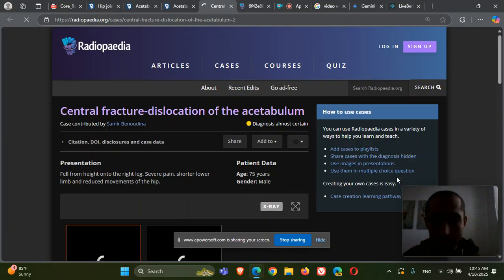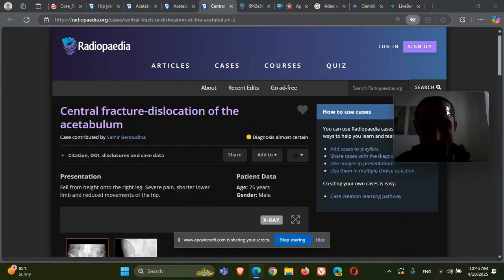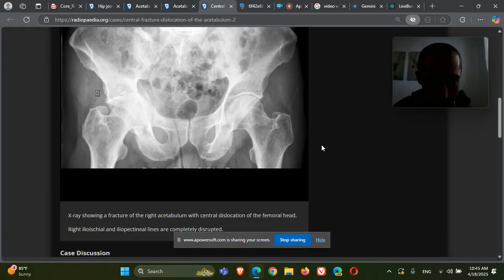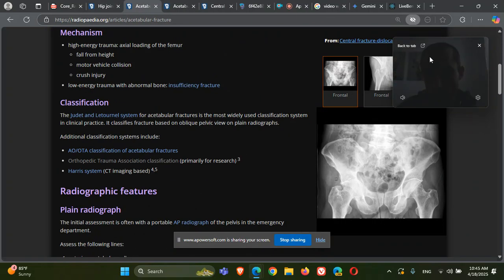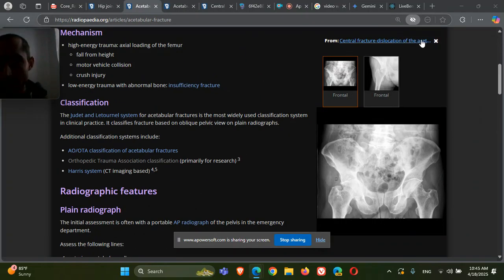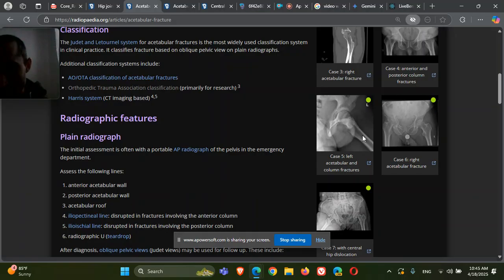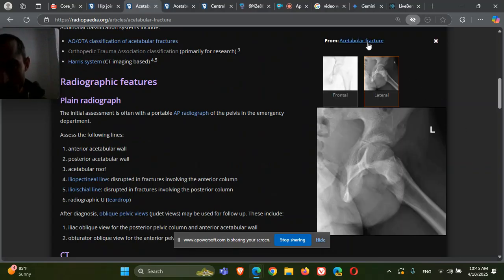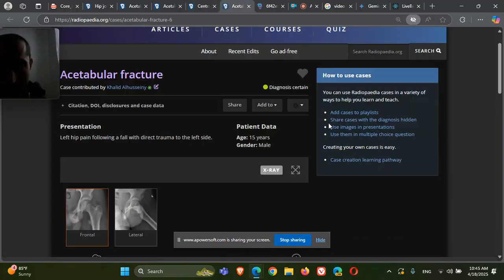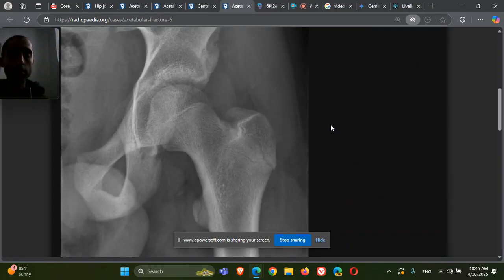Let's look at it. Maybe we'll be able to see something. Okay, this is very hard to see right over here. So this is not the best case I wanted to show you. Let's look at another one. Maybe this one. Let's take him. Okay, this one is okay.